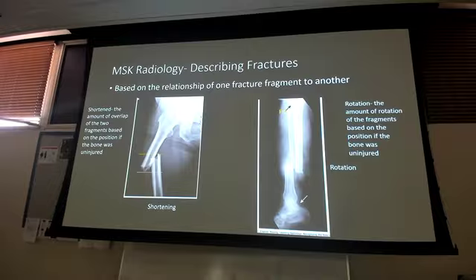In this case, it doesn't fully describe what's going on with that fracture, because it's also rotated 90 degrees down here. What you have here, and you'll see this more when we get to the lower extremity, is an AP tib-fib shot with a lateral ankle, which means that lower part of the tib-fib and the ankle is rotated 90 degrees. So if you were to just give me shortening or just give me lateral superior displacement, you're not painting the full picture, because that's rotated 90 degrees. Does everybody see that?